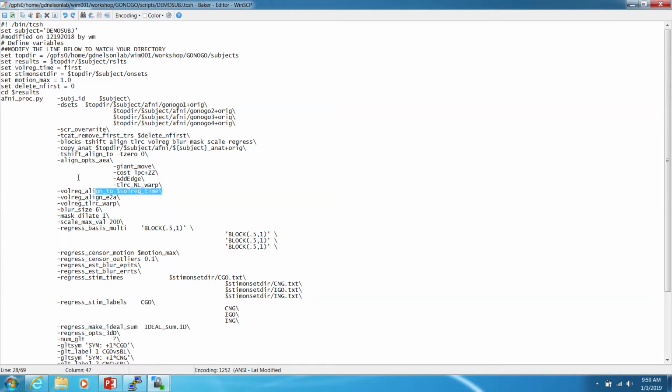The functional images have an X, Y, and Z component and also a time component. Each time we get a full volume of the brain, that's one TR. So when you're aligning everything, look at the first image we've got.